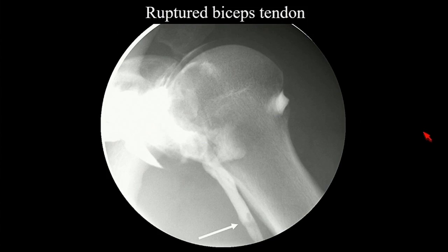So if you look carefully, when we do an arthrogram, you can either go high in the rotator interval, you can inject lower near the inferior medial humeral neck. You can also go posteriorly. Some people will be blinded or under ultrasound guidance. So it doesn't matter as long as you're in that joint. But the normal bicipital tendon sheath should end somewhere about this region.